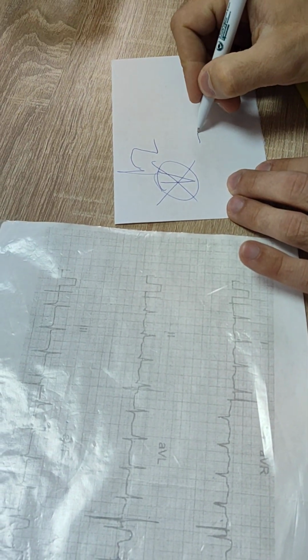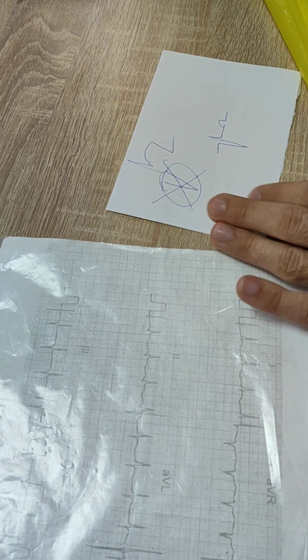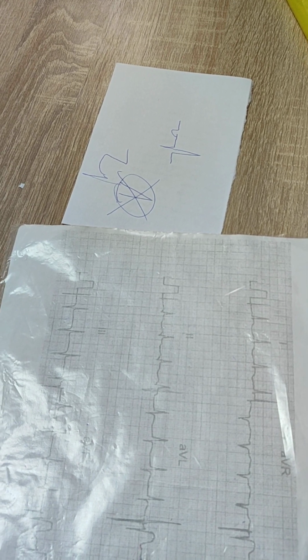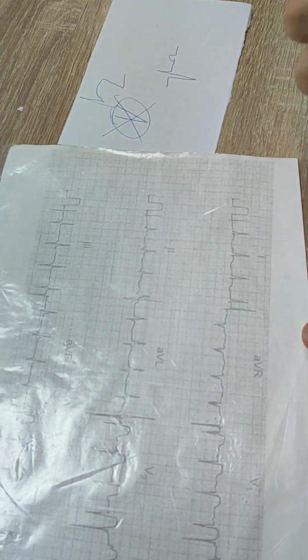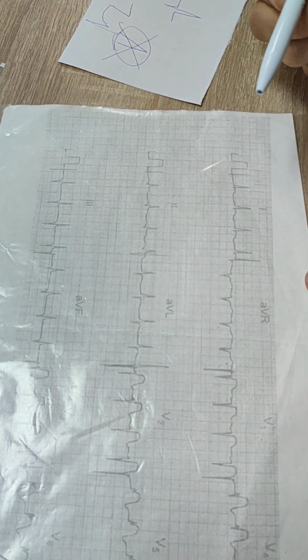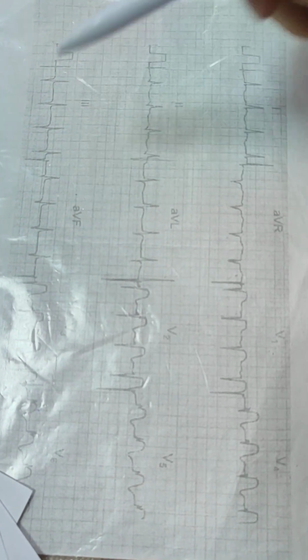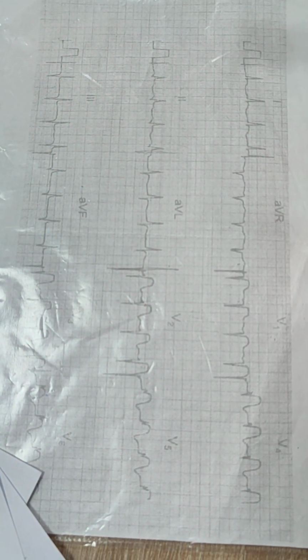In our case, there is Q wave, R wave, and normal ST and T. Stage number 4. It depends on the period, but we can conclude post-infarction cardiosclerosis. It is old myocardial infarction. The patient had it before. We don't know when.